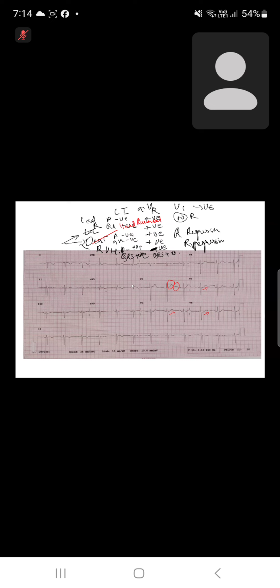But look at lead 2 and 3. In classic left anterior block, the S wave in lead 3 is always deeper than the S wave in lead 2. Here, lead 2 has a deeper S wave than lead 3. This generally goes with some form of chest deformity. But this electrocardiogram is very poorly taken. Even the chest leads, as somebody pointed out, are not done properly. It should be redone. But if that is true, look at the possibility of some form of chest deformity, pectus excavatum or straight back, etc., which can produce such electrocardiograms also.